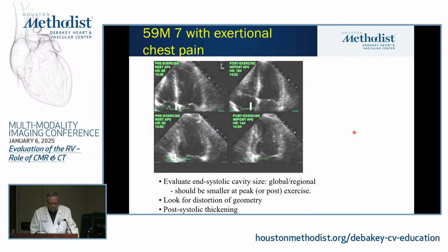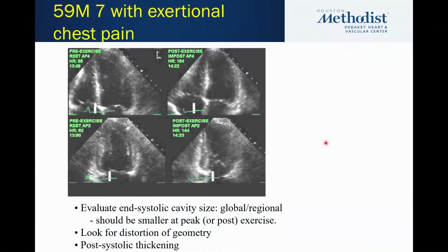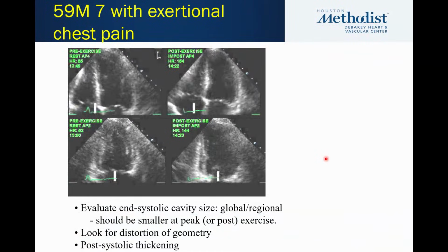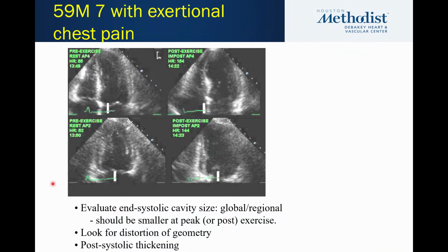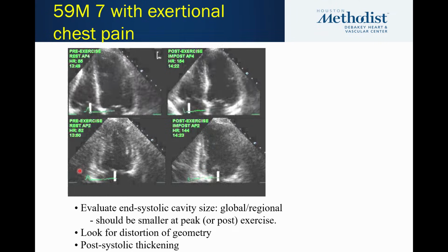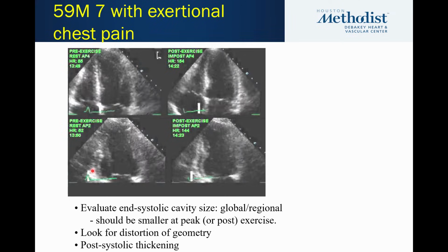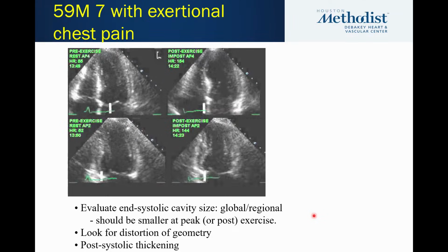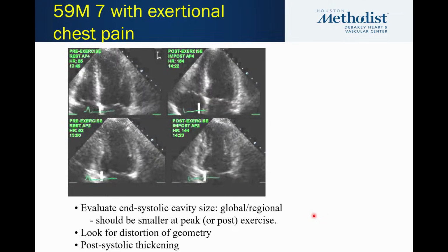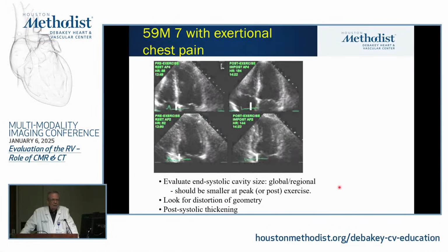Again, using all the clues, this is a regular post-exercise treadmill. I'll give you a little bit of time. Whoop, what happened? Stop working? No, don't do that. There we go. Okay, normal or abnormal? Normal, raise your hands. Abnormal, raise your hands. Okay, and the rest are insecure.